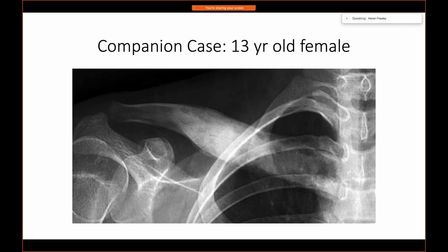Bartonella. The osteosarcoma? Okay, somebody says osteosarcoma. Unusual in the clavicle. I agree with Kieran. Cody, what do you think, since you nailed the first part of this case? Still concerning because of the periosteal reaction. Not a typical place for infection. Okay, so you heard your other attendings sort of give you a clue.